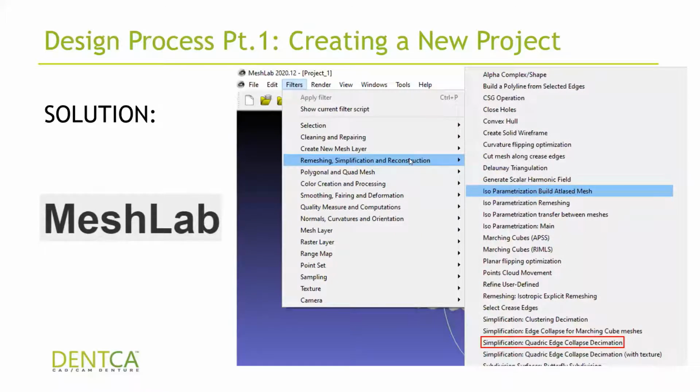By the way, the reason this sometimes happens with your intraoral scan files, so you keep this in mind when you're scanning, is that the more time you spend scanning, hitting that button and scanning the areas, the heavier your file becomes. So you might want to try to scan as quickly and accurately as possible without having to go back to specific areas, because every time you keep that button on, the file size increases and you can easily end up with a file that's 80 megabytes, 100 megabytes, 120 megabytes. So that's one thing to keep in mind, and we're going to talk more about that in the next session.